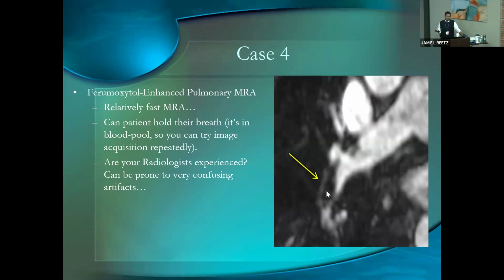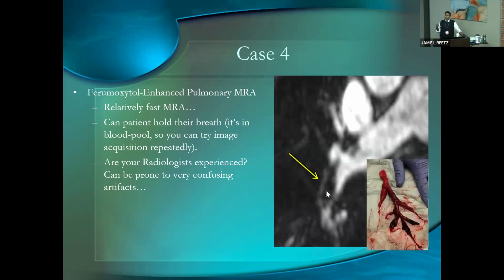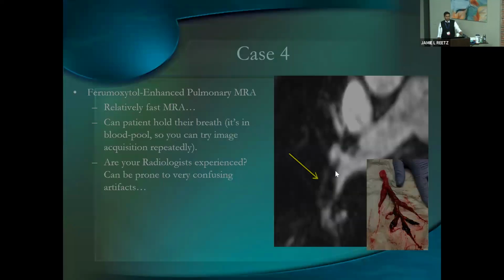I did not put the grossest animation I had in here, but I'll give you something semi-gross. I always tell people when you look for thrombus in a pulmonary MRA, it's a very boogery, gross, clotty, goopy looking thing. So it has to look like this, and that's when I make a call. And this is obviously a blood clot on pulmonary MRA in all its glory that really just casted itself into the pulmonary artery. But the idea here is, again, pulmonary MRA is the way to go.